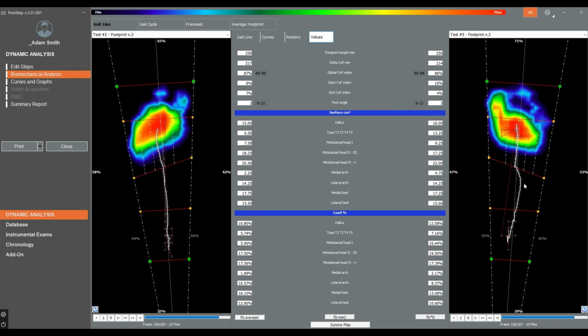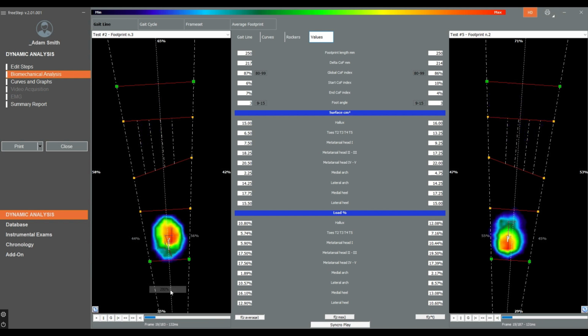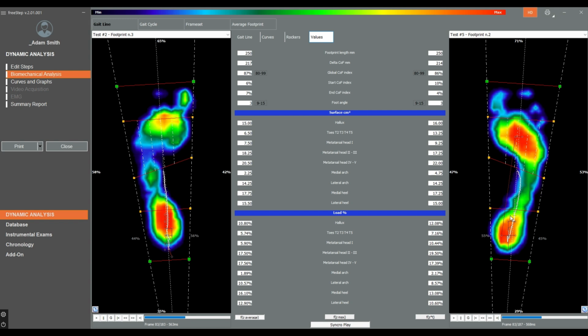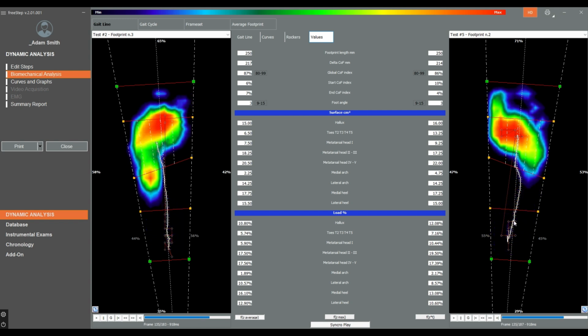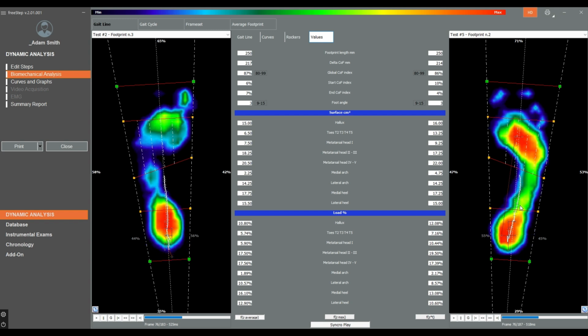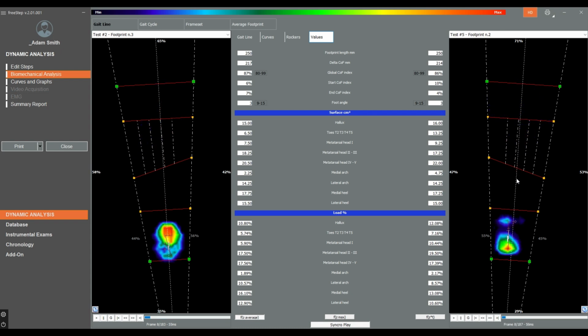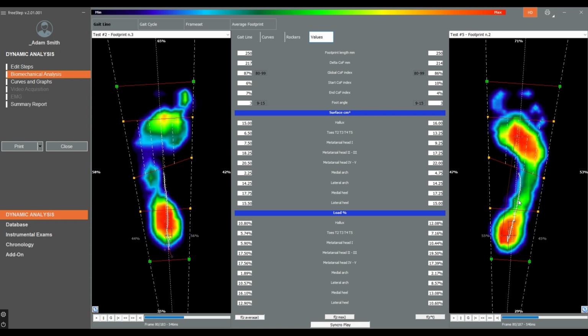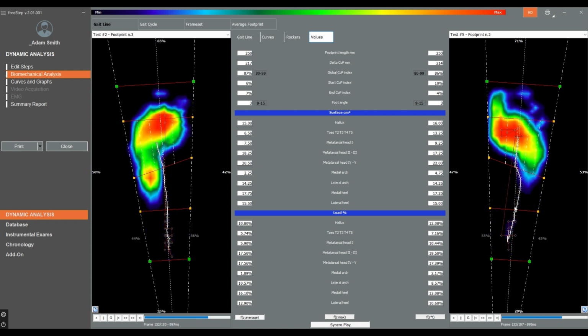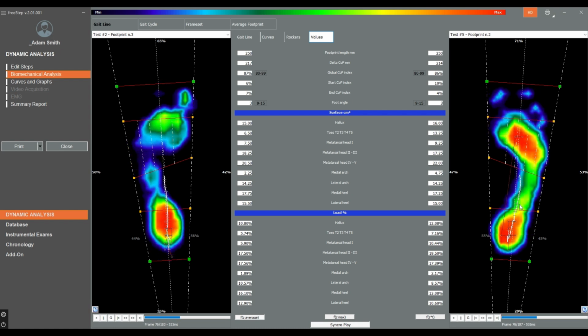If we switch over to the right side, and I'm going to speed it back up again so it's not painful to watch. You can see there's a spur, like a spike of red that goes through here. Again, that's abnormal. It follows the right path. We do actually want it to take that path, but not this fire of red that happens here, almost like a splurge of lava from a volcano right here.